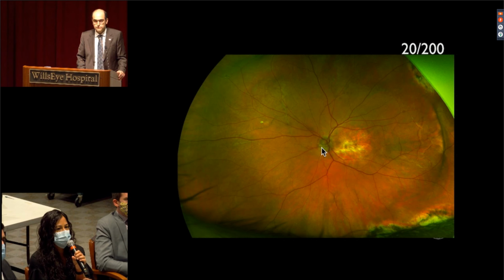And then similar findings here. We see linear streak-like lesions radiating off of the optic nerve, extending out to the periphery. Looking at the macula, there's a large area of what looks like retinal atrophy with pigmentary changes throughout. We skipped the vasculature. So vasculature overall looks normal.